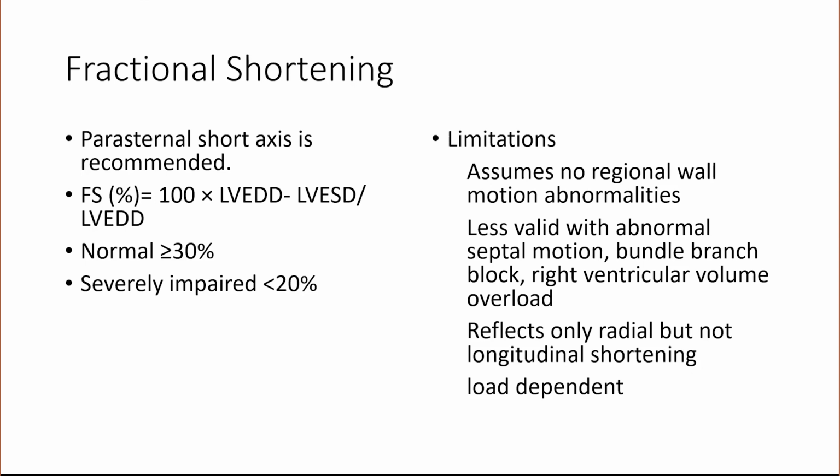Some of the reasoning is that in parasternal short axis, you have multiple points where you can measure the diameters, while in parasternal long, it will just be one. Wherever you can have a clear distinction of the endocardial border, you can draw the line. Also, as opposed to adults, congenital echoes recommend that we do it in 2D rather than in M mode.